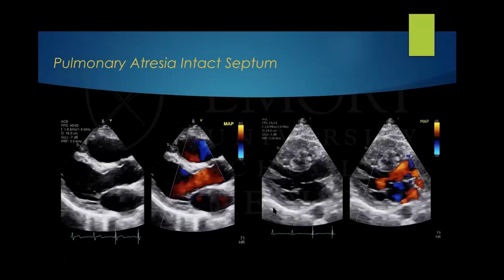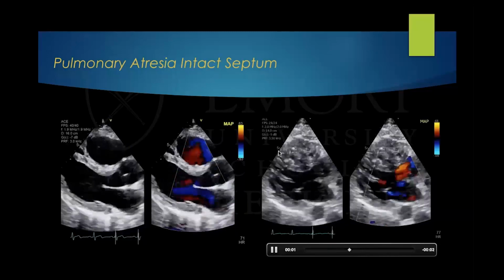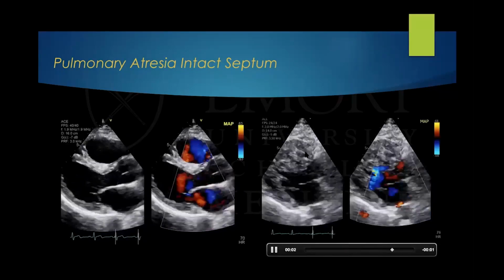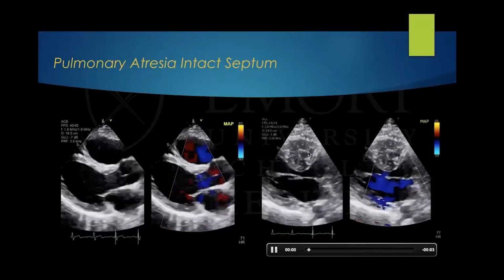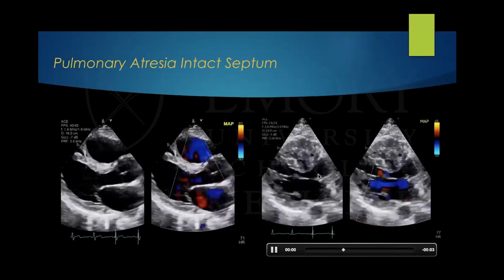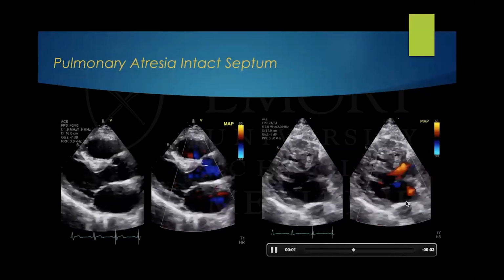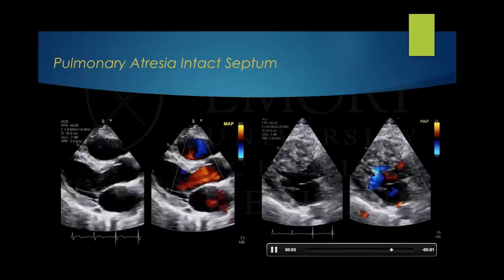The more severe type, like you see here, is where there is actually no formation of the right ventricle. All this is hypertrophy from very high pressures. And usually in these ventricles the tricuspid valve is dysplastic or very abnormal. This is the left ventricular outflow tract. This is a pulmonary vein draining into the left atrium, but the mitral and aortic valves seem to be normal.